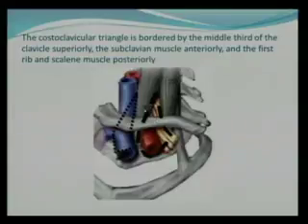So this is again the scalene triangle that we spoke about, the interscalene triangle that harbors the first, second, and third divisions of the brachial plexus, the anterior scalene and the middle scalene muscles, and also the subclavian artery that is partly housed during partial course within the interscalene triangle. Now you talk about this second triangular space, which is a possible cause of compression. This is the costoclavicular triangle.